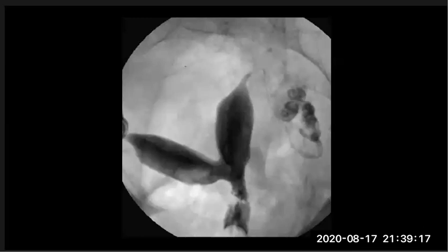How to differentiate? In hysterosalpingiography, we should measure the angle between the two uterine horns. If it is less than 75 degrees, it goes with septate uterus. If it is more than 105 degrees, it goes with bicornuate uterus. So here it is less than 75, so it is septate uterus.